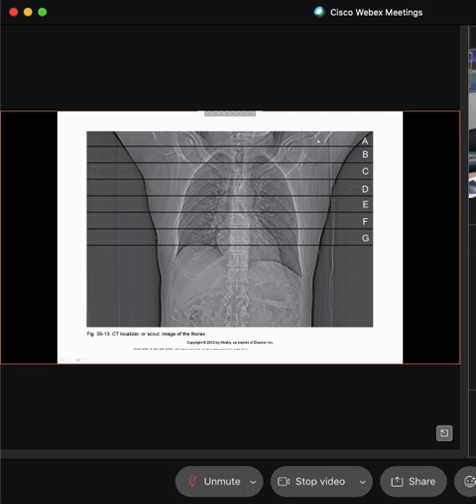Makes sense, right? We see both a left humerus and a right humerus. What we're looking at is an X-ray. We see humerus, heart, lungs, liver, all kinds of things, right? But we know that once we slice this, we're going to be seeing it inferior to superior. Does everyone kind of see where I'm going with this?